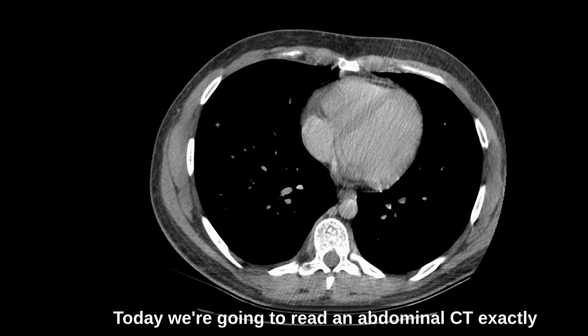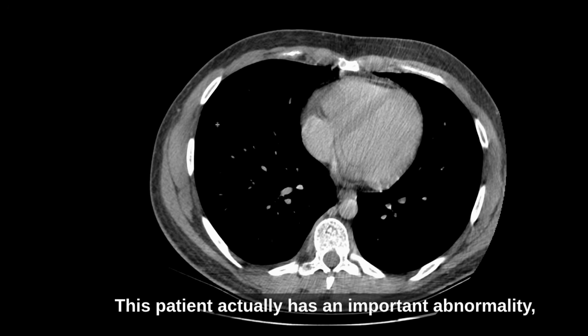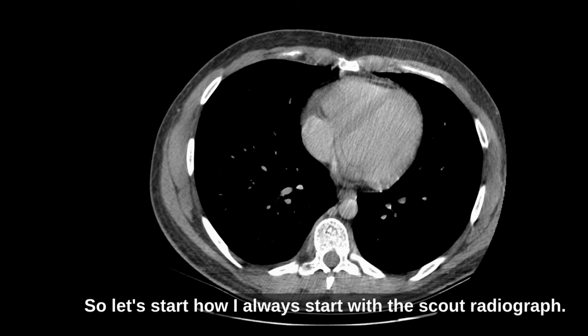Today we're going to read an abdominal CT exactly the way I do it in clinical practice. This patient actually has an important abnormality, but we're not going to jump straight to it. Instead, we're going to use a systematic approach and see if we can find it together. So let's start how I always start, with the scout radiograph.